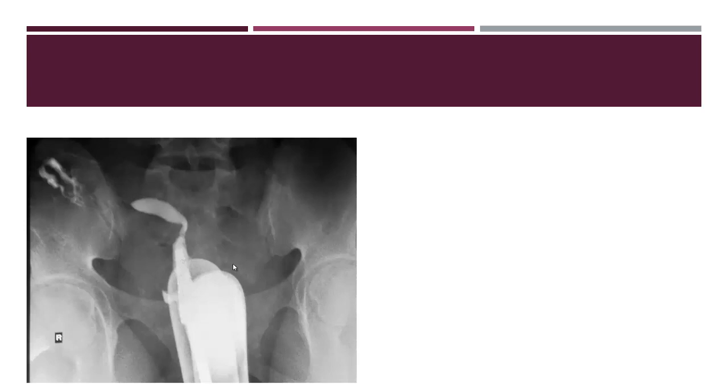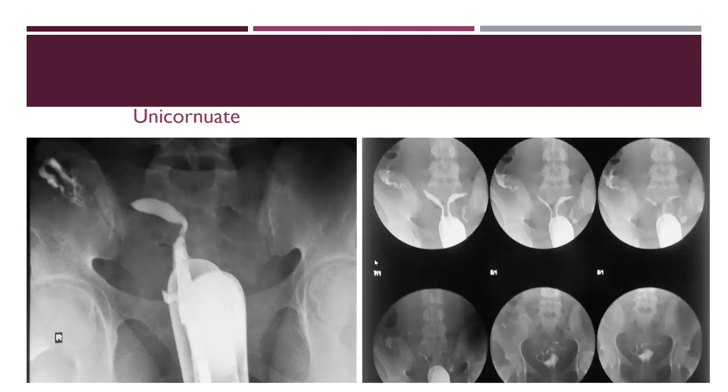Again, this is abnormal uterine contour. It's banana-like shaped appearance of the uterus, but in this case, take care that the uterus is not pulled by the tenaculum. Second, take care that it is not one orifice of a second orifice of uterus didelphys. So this is unicornuate uterus, but you must take care that there is no another one.